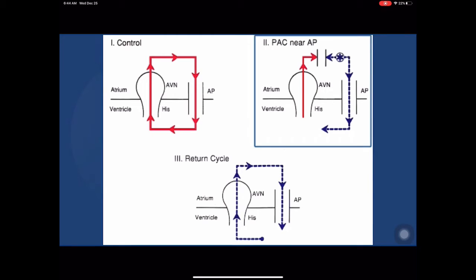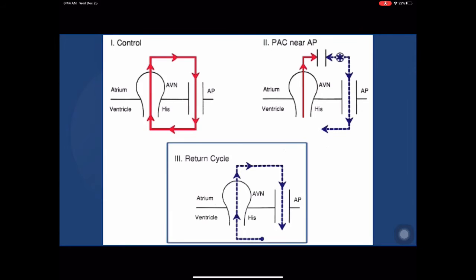So right around here, here's that CS catheter that I showed you, the MCS. We put a PAC in right here. This PAC cannot reset the local A, and that's the critical thing, because you can make a lot of diagnoses if you capture this A. But the fact that we did not affect the septal A means that if this A comes in early, it cannot be due to this beat here. Now this beat goes down to the ventricle, and that's the early V we saw. But now you have to track it around and see what it does.